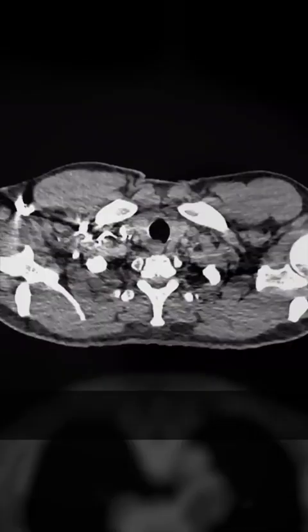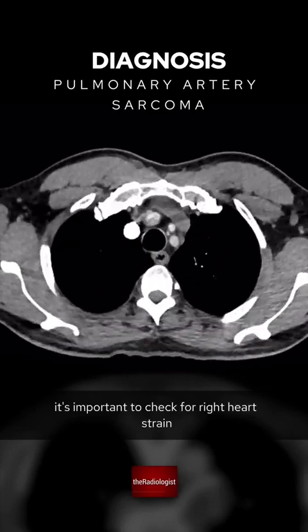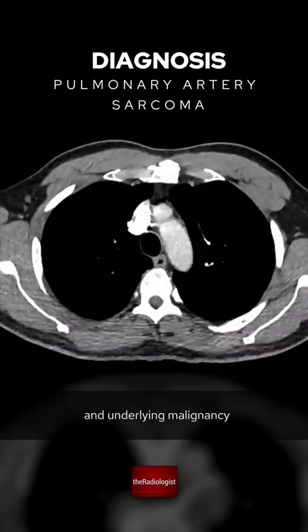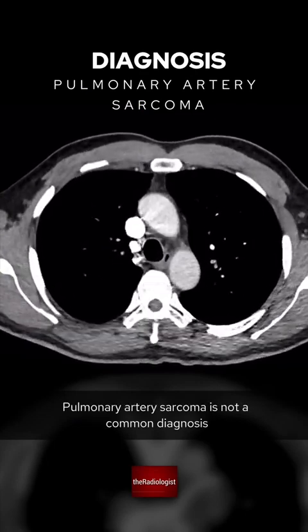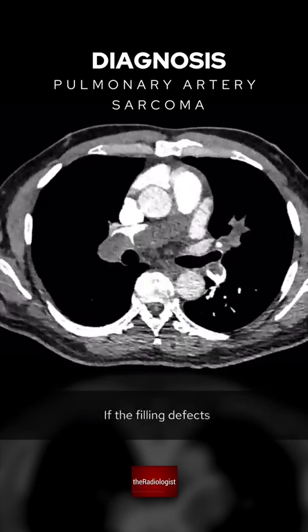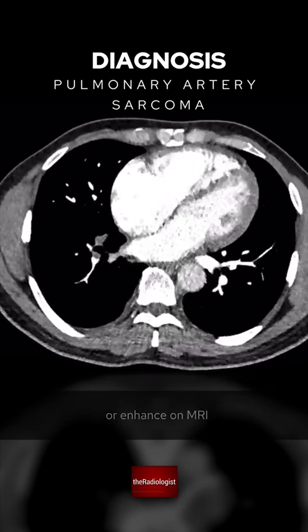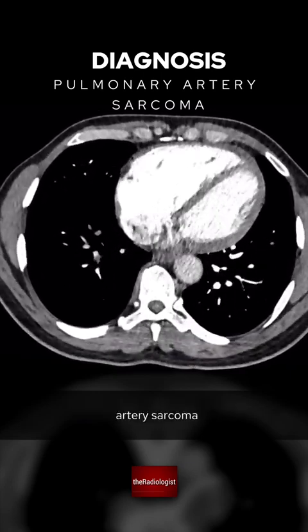And in general, when you find a positive CTPA, it's important to check for right heart strain, signs of chronic disease, and underlying malignancy. Pulmonary artery sarcoma is not a common diagnosis, however I have seen it more than once. If the filling defects are persistent and avid on PET or enhanced on MRI, then it's worth thinking about a pulmonary artery sarcoma.